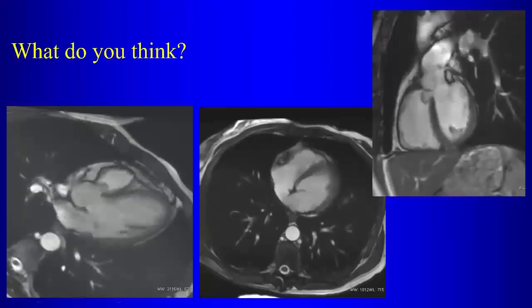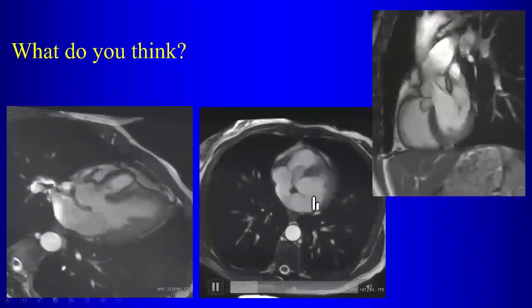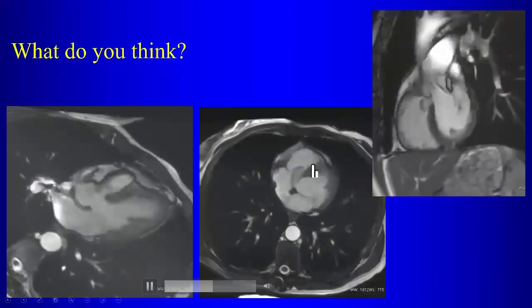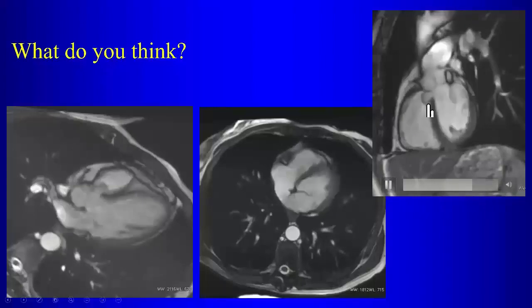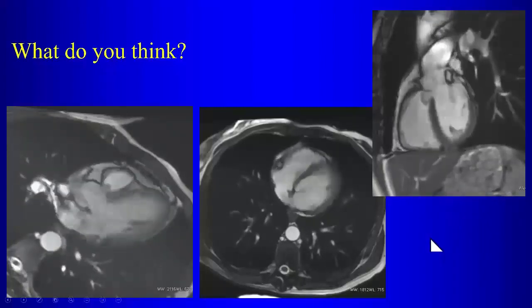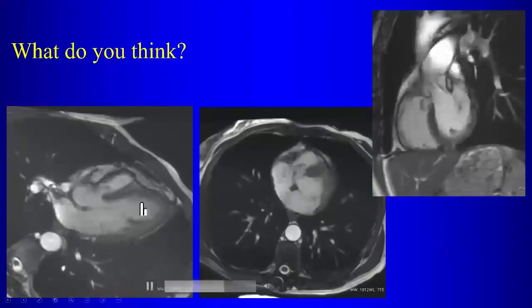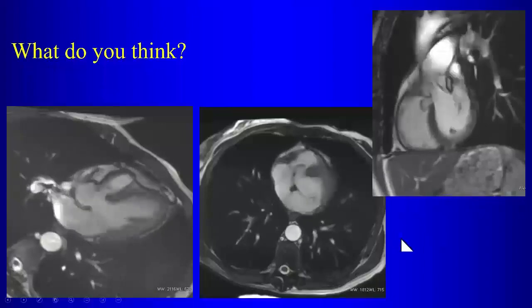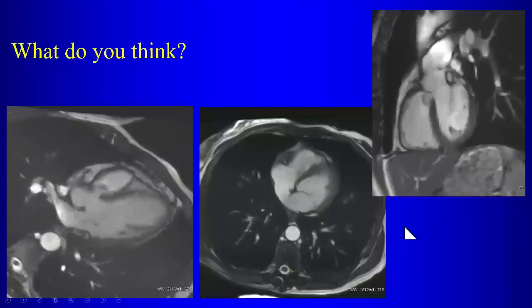There's a contained VSD. Well, there's something funny looking here. See it? Do you actually see a jet going across there? Yes or no? It looks like a bubble, right? But there's no jet going across. So what do you call it if something bulges out like that? Aneurysm, right. Do you know what this is called?